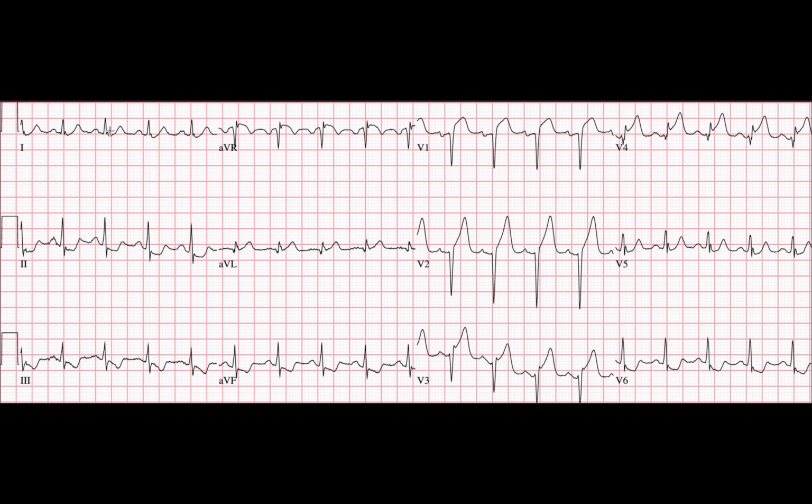Now I told you we had the PQRST, so what I'm highlighting here, that little bump going up, that's the T wave, right? Well, you notice this T wave here actually goes down. We call that ST depression. Remember, P, Q, R, S, and then T. So this one's somewhat normal. But then you see this ST, and this S, and then this T part, that's depressed. And what I mean by depressed is it's below the average electrical activity area, or what we call the isoelectric line. It's below it. Notice that S and that T is below the normal area, versus if we look at lead 2, that's pretty much above on average for the whole thing.